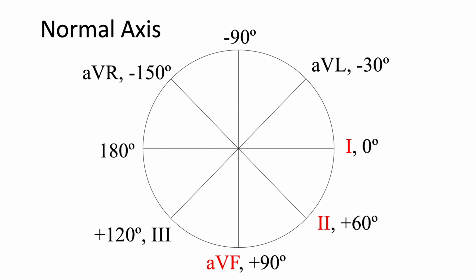Okay, so this is the Cabrera system. I'm sure that most of you guys have seen it that have been studying cardiology, but essentially this is how this whole diagram works. So if you have a normal axis, we already talked about how it's lead 1 and 2 that are going to be positive. So the way that you use the Cabrera system, let's just start with lead 1. If lead 1 is positive, you're going to shade in the half of the circle that is perpendicular and closest to that lead. So lead 1 is positive, it's perpendicular here, and then you color in the entire half that's closest. If it was negative, you would do the exact opposite and you would color in this half of the circle. Lead 2 is the same way.